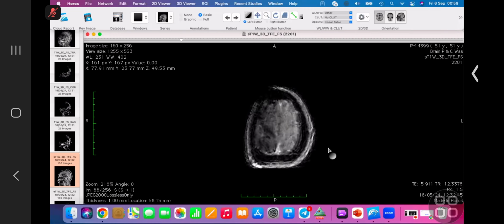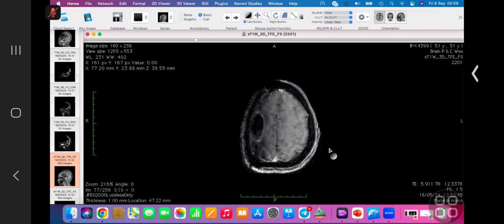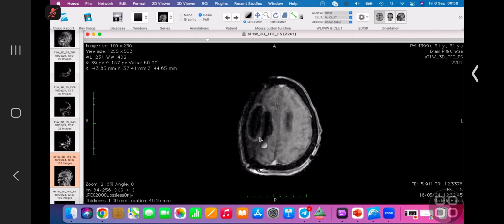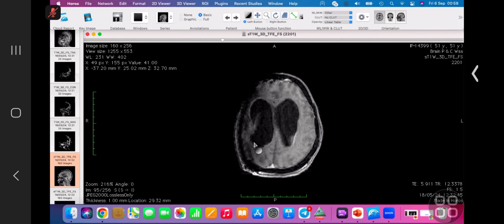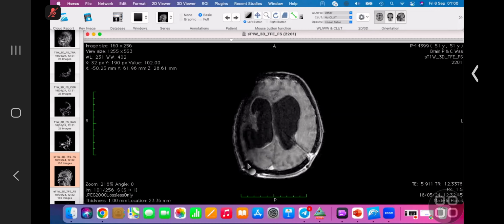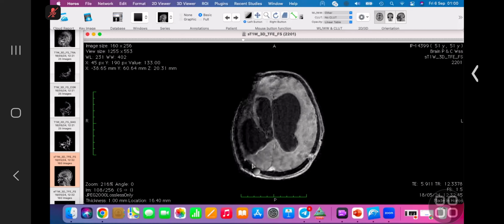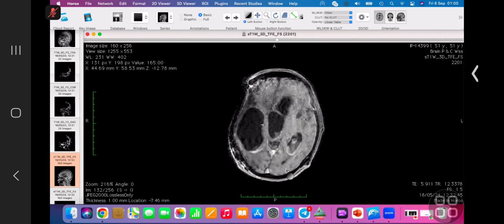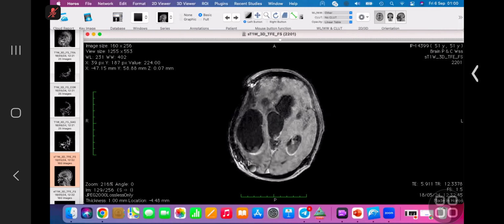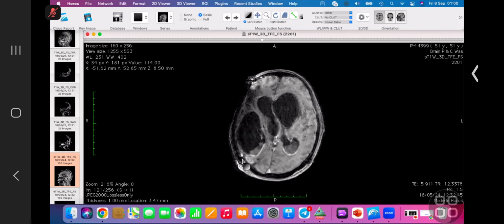So what is your final diagnosis? There is also enhancement of what I presume is a choroid plexus cyst. So I'm suspecting acute ventriculitis. Is there something here? There is something here that is hyperintense. It might be enhancing at the right occipital lobe.